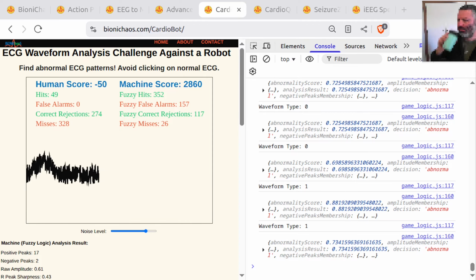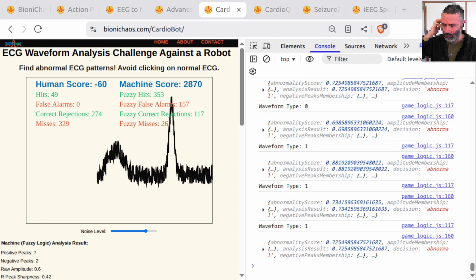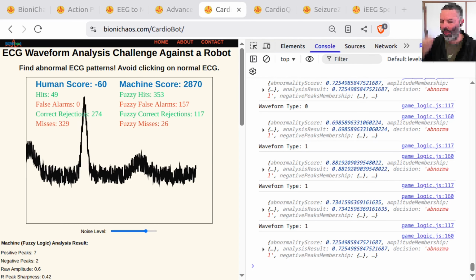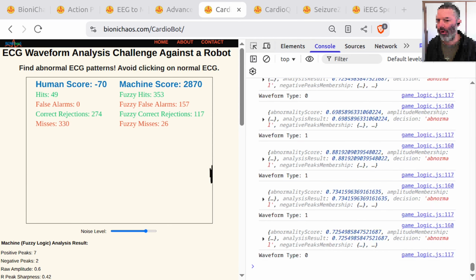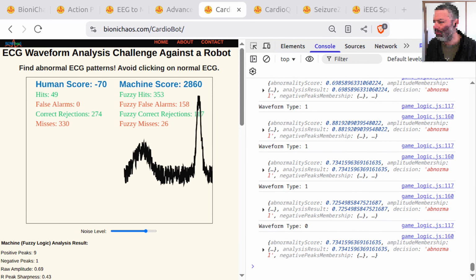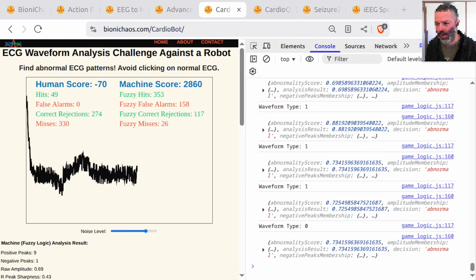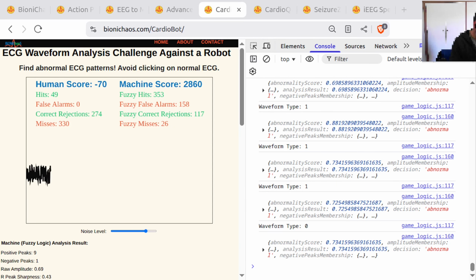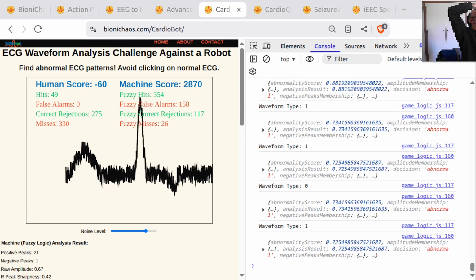Part 2, the segmentation game. We're not just flagging normal, abnormal. We're demanding precise PQRST segment labeling. That's a huge leap in educational value. It forces accuracy. You don't just get a point for clicking, you get 5 points for pinpointing the 5 little peaks and valleys. And if you're slow, the bot swoops in, claims the point, and probably makes a snarky noise.